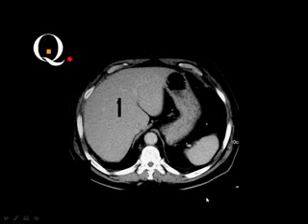Then this was a quick review of the anatomy of the liver, and what you expect to see through the CT scans of the liver in normal conditions. Then, as you know, I used to project some quiz cases at the end of each talk just to test your knowledge.